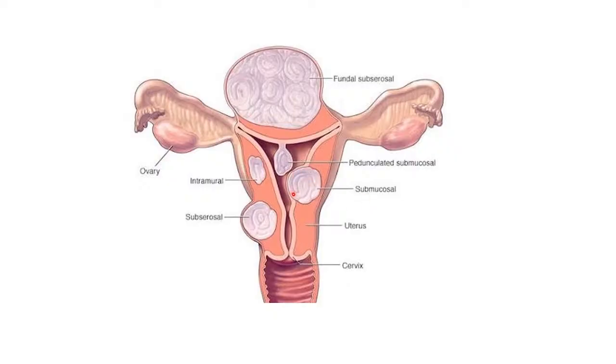That's the one that dents the endometrium like that. So that's a submucosal fibroid. Then you can also have the one that is found within the myometrium. Now this is called the intramural fibroid. The one that dents the perimetrium like this is the subserosal fibroid. We also have another fibroid that is very difficult to distinguish, that can stretch all the way from the subserosal part to the endometrial cavity, a big one. That's called a transmural fibroid.